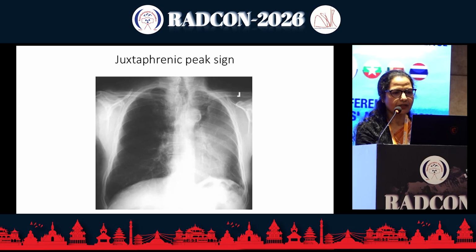Then juxtaphrenic peak sign, we see sometimes the peaks in the hemidiaphragm because of the traction in the inferior accessory fissure, major fissure, or pulmonary ligaments. We get this juxtaphrenic peak sign.